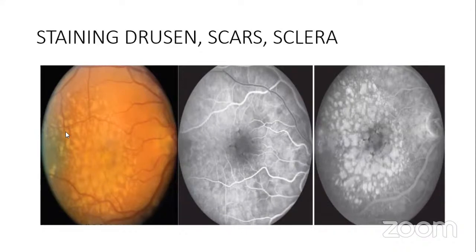If, for example, instead of having drusen, I have a form of a retinal scar, and I see a hyperfluorescence over it, clearly that hyperfluorescence in the late phase tells you this is a scar. So you don't know it just by saying the hyperfluorescence was like this, so it's a scar. It's stained. So what you take from it is, you correlate the fundus photo to the angiogram.